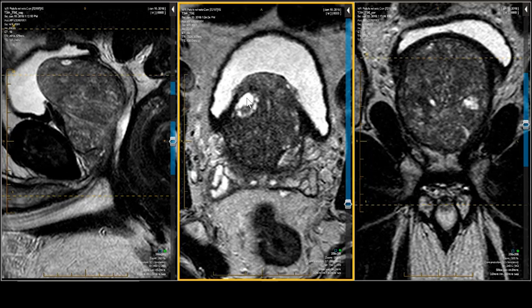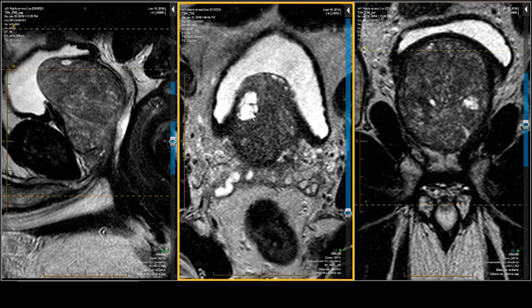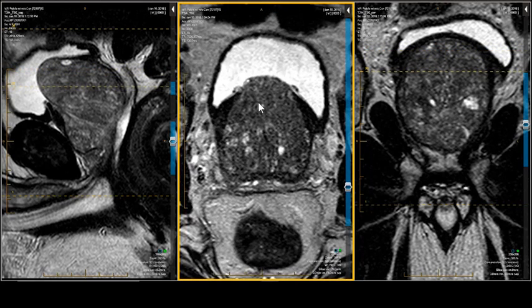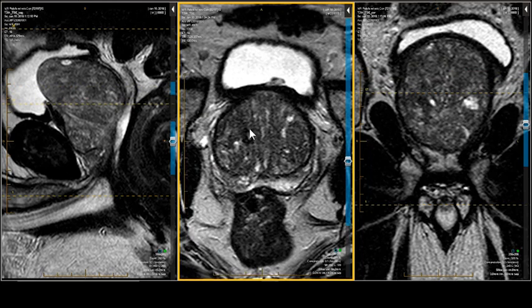Now, within the prostate are these well-defined hyperintense nodules that have this acinar or glandular look to them. They'll be hypovascular, so that's a good thing. They'll show up very bright on the B0 image, but as you increase the B value, they'll dissipate, which is also a good thing, so a sign that they are not cancer. And you'll also have some solid gray nodules, like this one right here, and they'll also be well marginated.